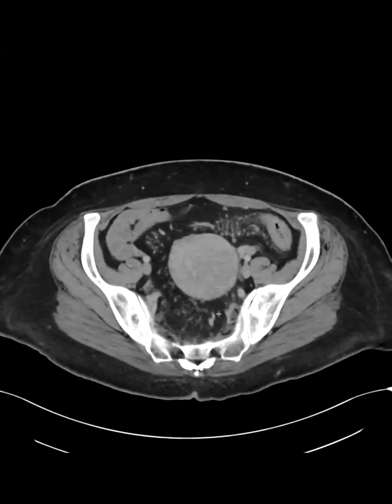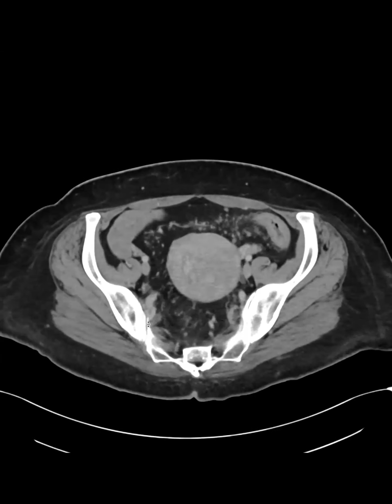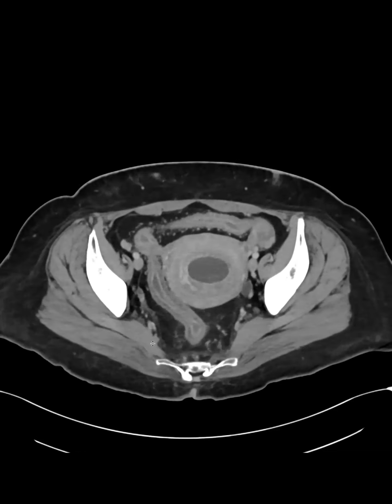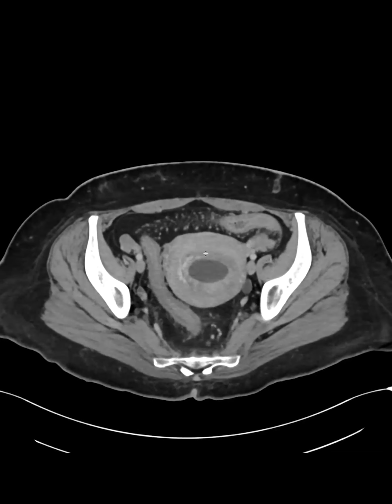Yeah, the HCG did come back positive, and so this was a new diagnosis of an IUP. I know we don't see IUP commonly on CT, if ever, but this is a great example.